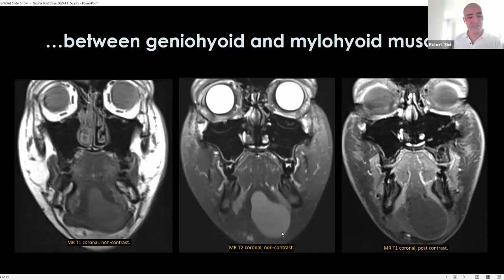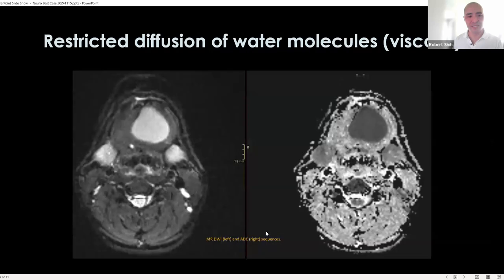The most common cystic lesion that we see in the floor of the mouth will probably be the ranula due to a mucocele of the sublingual gland. However, this is a bit larger than we normally see with a ranula and a bit more midline. The ranulas tend to be more lateral, and often by the time they get to the size, will rupture into the neck, into the submandibular space. So this is a more rare diagnosis that you could actually go your entire career potentially without seeing.